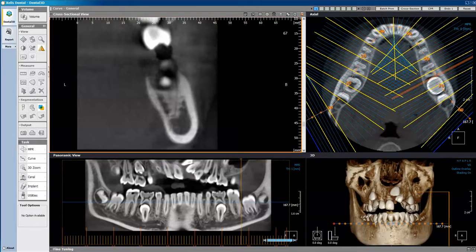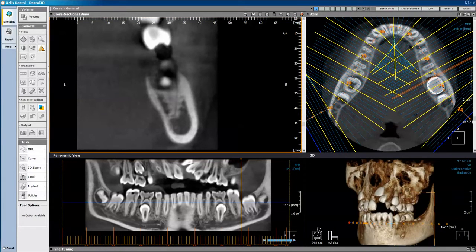So this will actually save this project, and if you look at the toolbar at the top, there will be a number 1 in a blue box which represents this arch that I've created. Any project savings here or any manipulation of this particular project will be saved in this first box here.